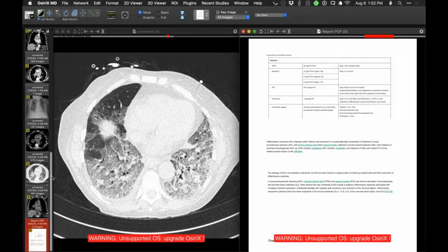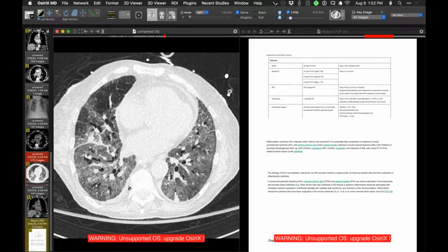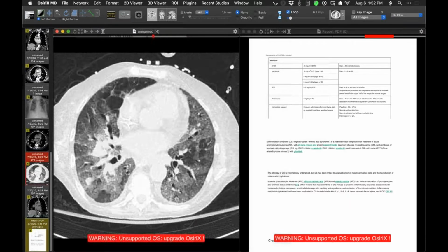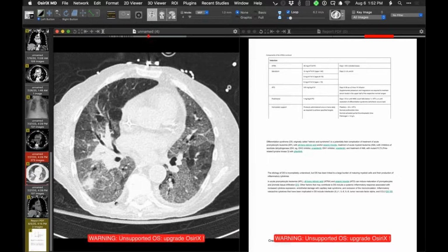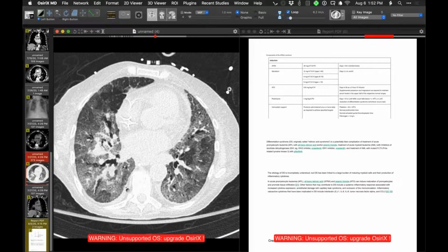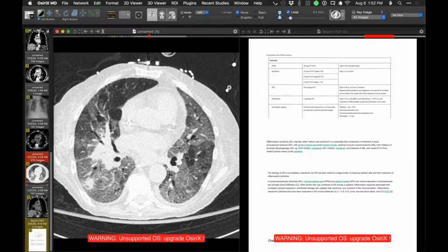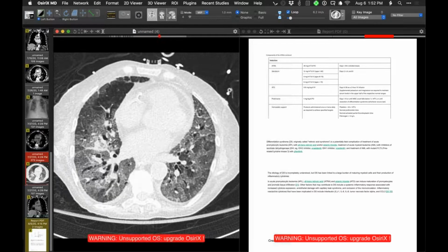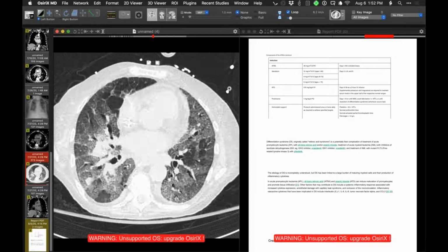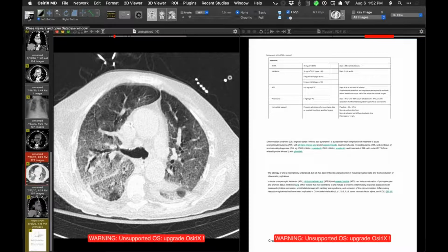Over time, this patient did not do so okay. So this is on the 27th. And because she didn't, they stopped the drug. She wasn't doing okay. And somewhat troublesome, she started to develop these nodules separate, superimposed on this. So there was a concern for not only the differentiation syndrome, but the possibility of complicating infection now. And I'm not sure what happened to that, but rather severe disease in this person.